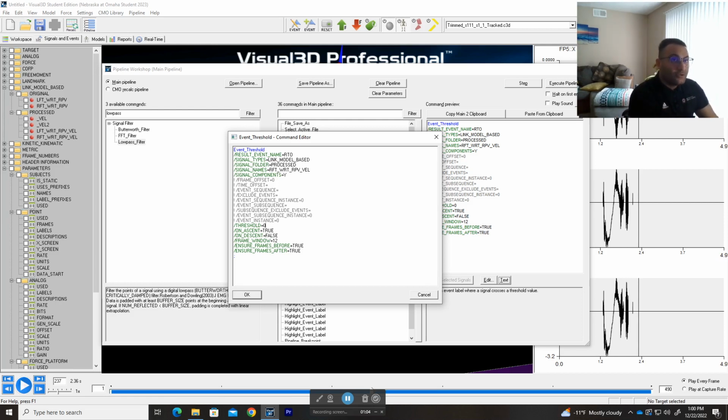So Zenya's code uses the velocity of the foot to predict the toe offs and heel strikes. When it's toe off, it predicts that by detecting when the velocity goes from negative to positive. That's the toe off, and that's why we use a threshold of 0 on ascent. Yes, because we're trying to go from negative to positive. On descent, false. We don't want to do the opposite, so that's why we put false here.